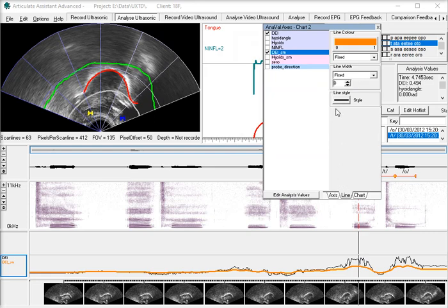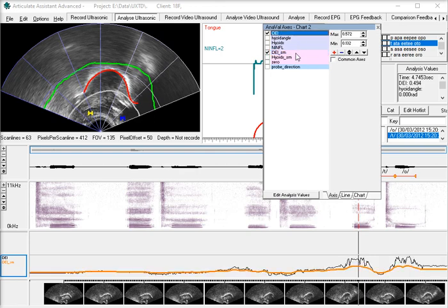There we go. And if we change this to the axis value, we want both of these to have a common axis, and then to find the maximum minimum extents to plot it. And you can see now that there is a smoother version of the dorsum excursion index. This is probably a more reasonable estimate of this dorsum excursion index value.